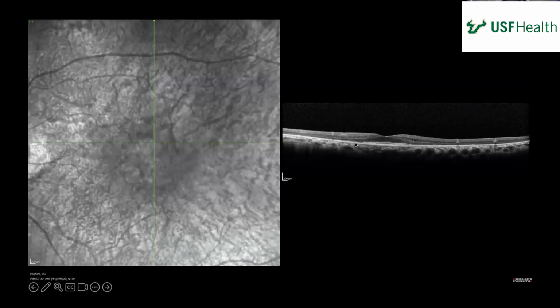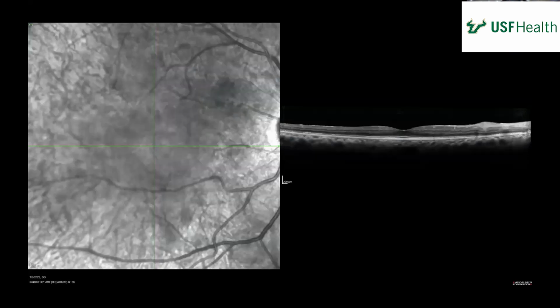And that's why these are more prominent. See that this is still the same vessel that you see, but the retina is super thin. So those are more reflective because the light is not having to pass through all that annoying retinal tissue that attenuates it. And that's why your choroidal pattern is so much more prominent and well imaged, because you're getting a lot more transmission to the choroid, so you can actually see the choroidal vasculature because there's substantial, clinically significant loss of the outer retina. Let's go back to the other vertical cut just to show the difference.